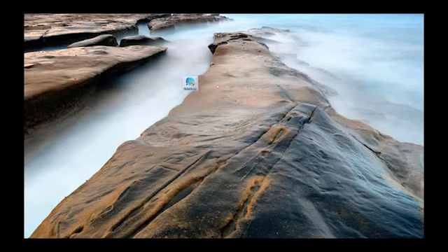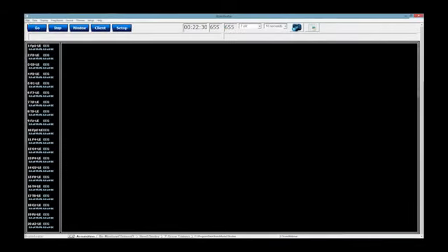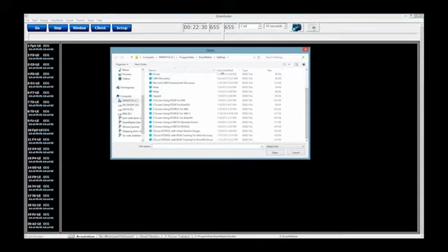Now, I'm going to show you guys a protocol that has just started to go into development. I got it pretty much done. I just want to run some testing on it before it really gets released to the masses. But it's going to go up and be available in that area where we were talking about. One of the things you got with our Voxel EEG right now is that we only have the capabilities of doing absolute power. At the moment, we don't have the abilities to do connectivities or anything like that. So, I've come up with a protocol that combines Surface ZScore connectivities with absolute power sLORETA training.